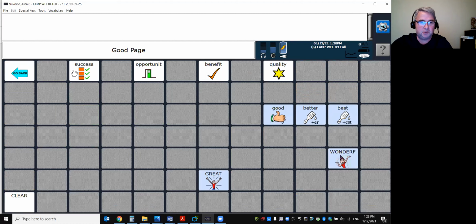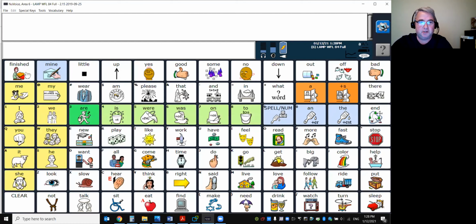All right, I hope that helps and gives you three good uses. Make sure every word looks right and sounds right. So for literacy and for texting and emailing and all those things, they need to make sure that when they hear a word, they see the proper spelling. And then they can also use it for humor, for literacy activities. And then the third use is for abbreviation expansion. I hope that helps and makes this changing of pronunciation fun and more rewarding and works well for your kids and adults you work with.